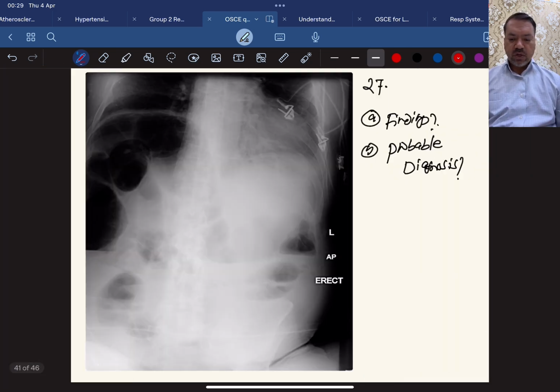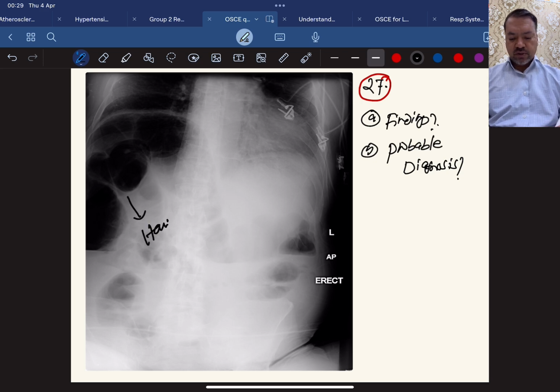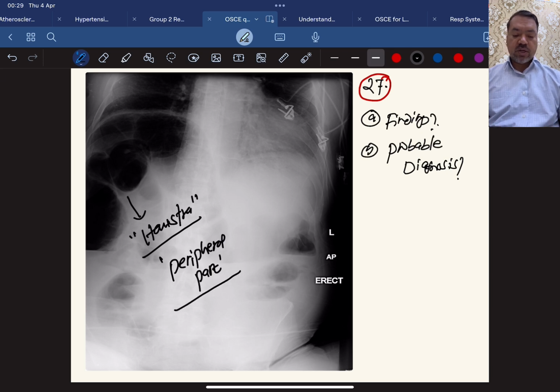Okay, let's move on. Another case here is another abdominal X-ray which is showing haustrations. Look at this. These are called haustra or haustrations, and the bowel loops are present at the periphery of the abdomen. If they give you a typical history, this patient presents with abdominal distension, vomiting, constipation, abdominal pain like that, this is a case of large bowel obstruction, or large intestinal obstruction.